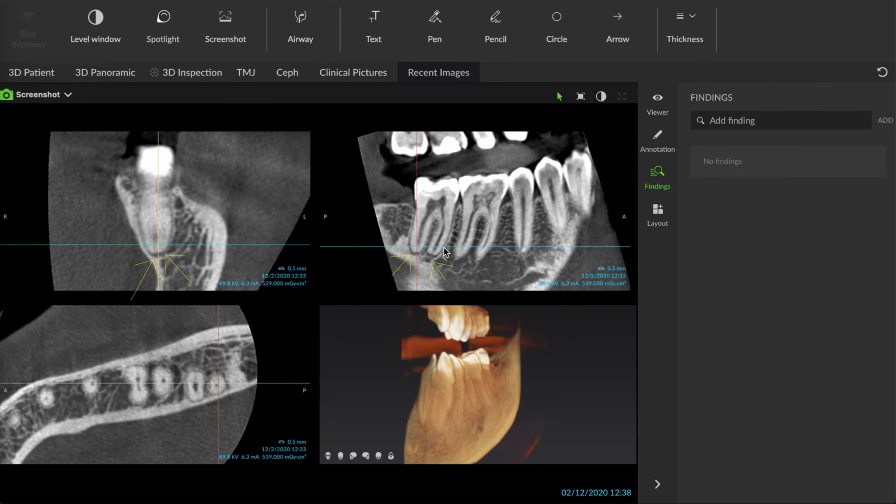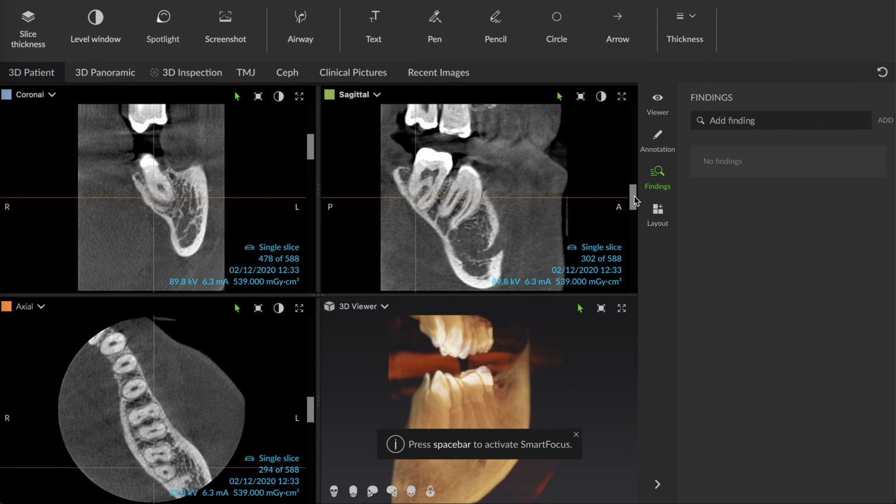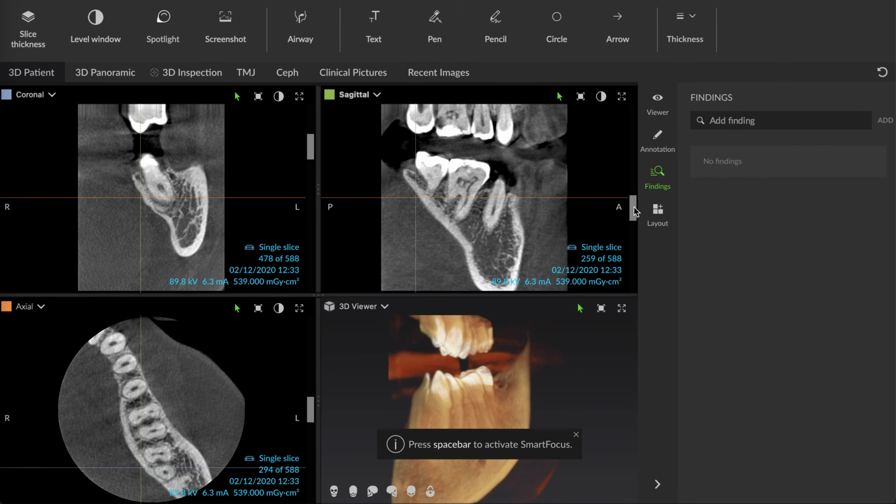But these two tell the tale. Periapical abscess that's spreading, widening of the PDL. Again, a necrotic tooth, definitely a problem, needing a root canal and a crown, a new crown. And then, you can also show them there's a giant number of pulp stones in this tooth number 19. There's a good chance at some point in the future we're going to need to consider a root canal based on the tooth's current situation. It may need a whole lot of help.